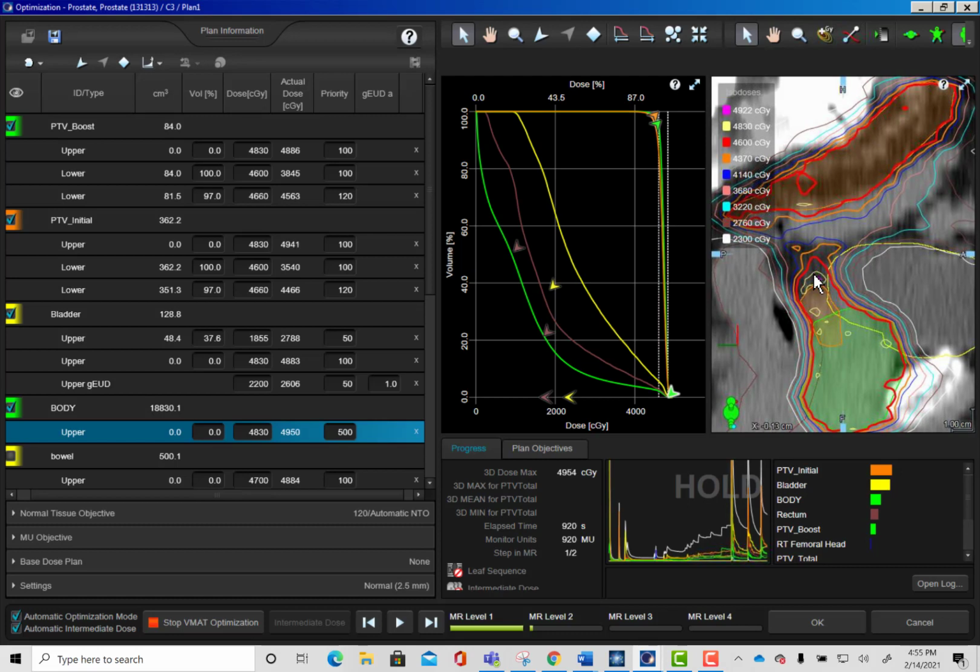as I can. Just because something you should always be shooting for is great conformality of your high isodose lines, at least. So like your 100, 95, they should be pretty conformal every plane you do. Well, 99% of the planes you do, at least. Okay, let's just play this.